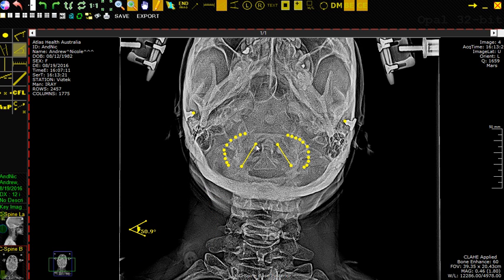Okay. One of the ways that docs have done it is they'll click on anterior point 1 and they will click here. And then they take their tool and try to approximate as close as they can to 90 degrees to wherever it's going to connect along this line. I don't know if there's a tool that will create an algorithm that will show exactly where and how these can connect, so that if it connects right here, it can determine that automatically. I'm not exactly sure.